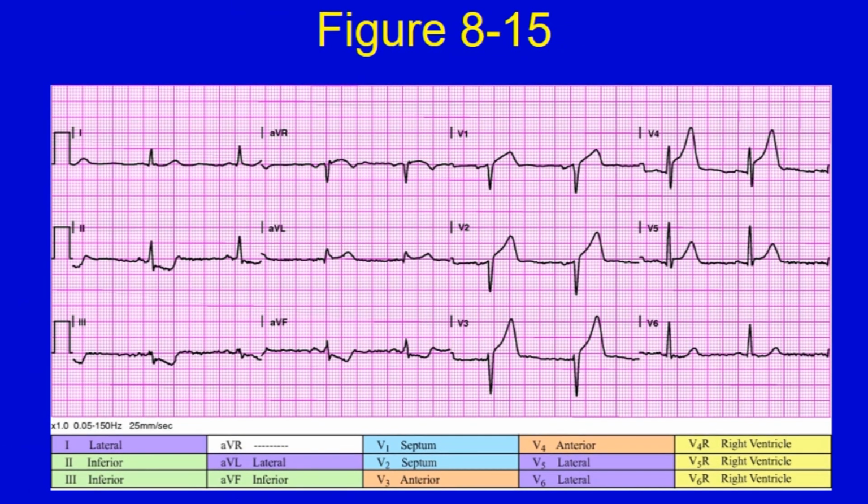This is why we're doing rate and rhythm. And they're a little bradycardic. Don't miss the bradycardia. Patients die with us looking at 12 leads, okay? Don't let them die reading the 12 lead. Not that that's necessarily knocking them down, but that may tell us part of what's going on with them. Okay? Yeah, yeah. They actually say 53, but I'm with you on the counting.